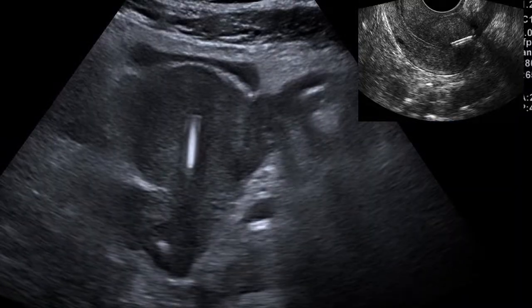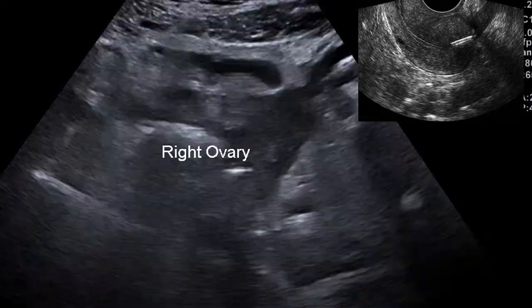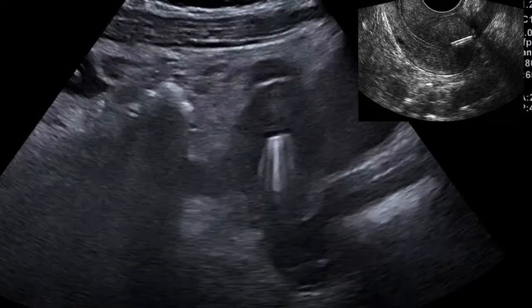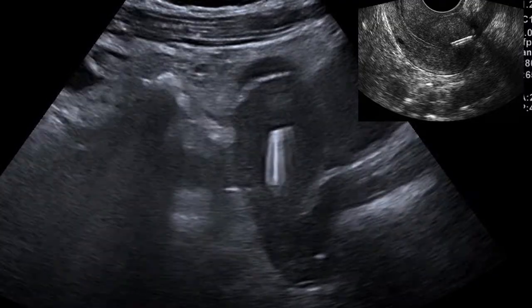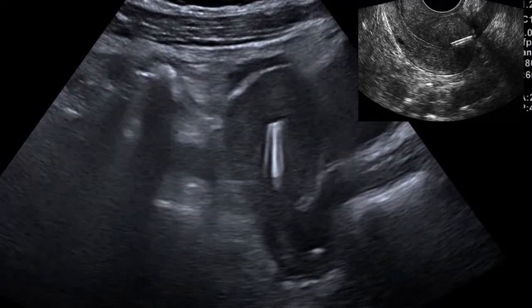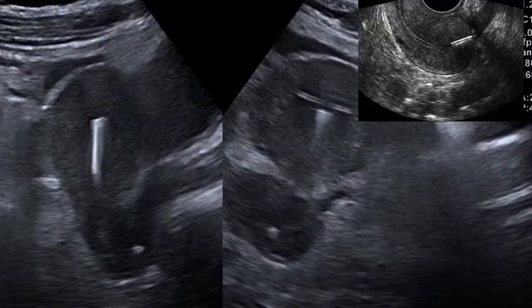So now the learning points in this case are: always assess IUCD location systematically. So you have this systematic way of doing things, and just not blaming the IUCD for crimes that it never committed. So a normally positioned IUCD is unlikely to be the cause of chronic pain, and ultrasound should exclude the alternative causes before recommending IUCD removal.